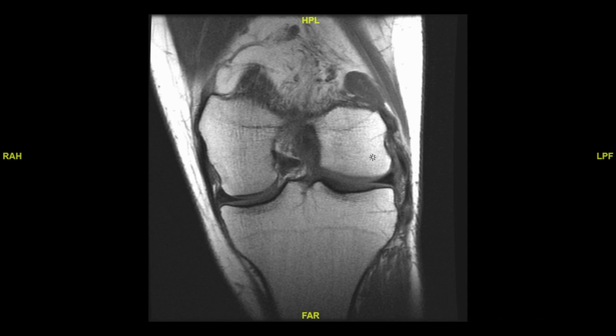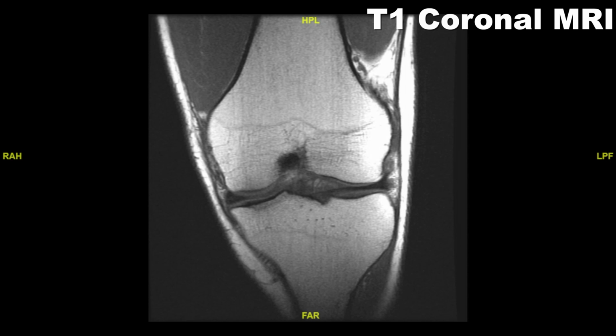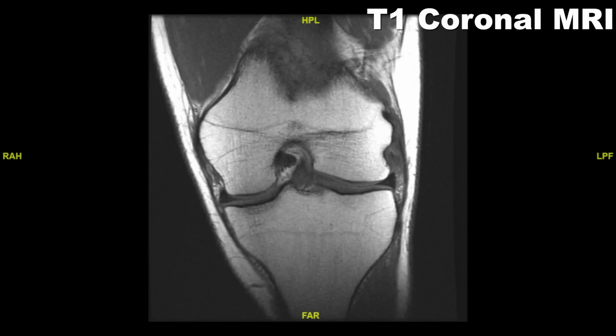Okay, everyone, so on this final set of images, we're looking at an MRI scan, but the image is processed a little bit differently, and so that's why the bones look white on this particular image. On the other images, the bones looked darker color. That's called a T2 image, and the image where the bones appear white and the fat is white, that's called a T1 image. And I'm just going to show you guys this because the contrast between the bone and the meniscus on this makes the meniscus a little bit easier to see.